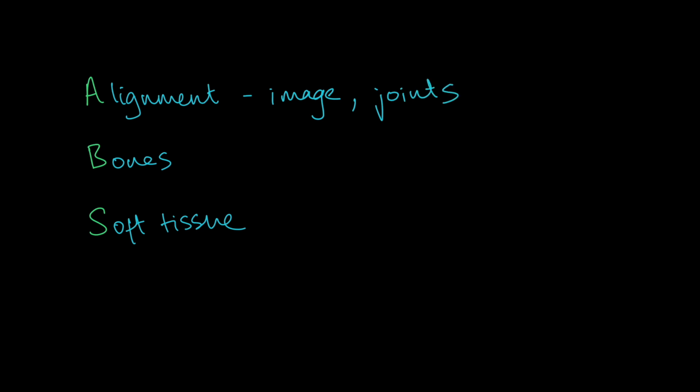So this will be things such as, firstly, whether the correct bones are articulating where we would expect them to in their respective joints, or also whether the joint spaces are correct themselves, because obviously that can change in the context of things such as osteoarthritis and so on.